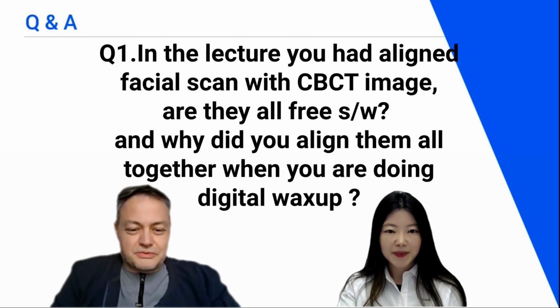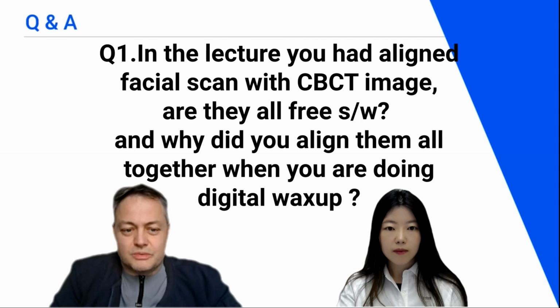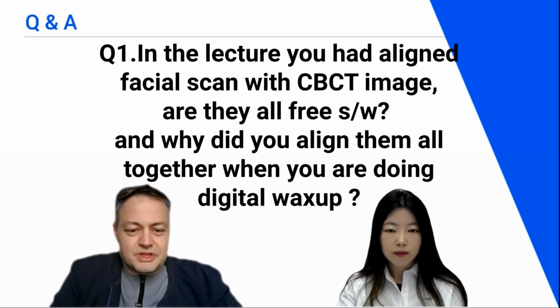So first, let's talk about face scans. Face scans can range from free software on your phone that gives a model of the face. Sometimes it's a low poly count, sometimes it's a better count regarding the program that you are using. And then you can go forward and buy maybe hobbyistic object scanners, or maybe even scanners like the one from Funk that I'm using, or maybe the one from Ray, that actually give much better face scans. And with this data, you can actually build better smile design for the patient, because you can put the teeth on a position that is actually beneficial for the smile of this patient.